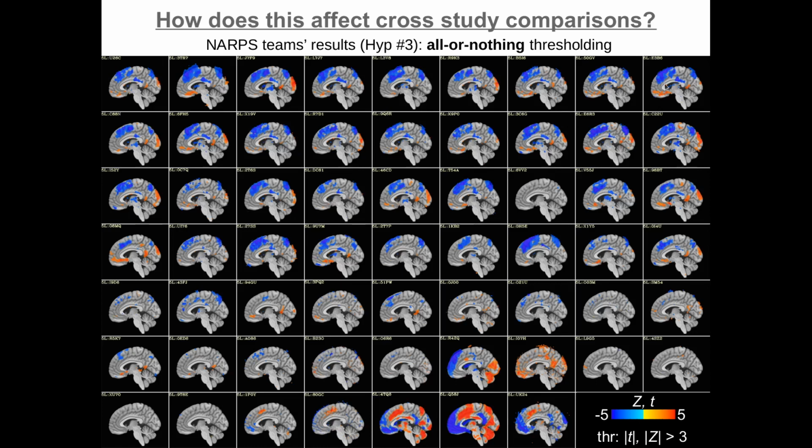If you look across the first row here, these look pretty largely similar. I see this blue blob here. It has a different size in each case. Okay. I see some red back here and some hints of red here. These largely agree, though the details might be different. And same here. And as I go along, well, what about this group here? If I look at this result, it seems totally different. This seems maybe what we call high variability or non-reproducible. And as I keep going down, I see more that really look very, very different.